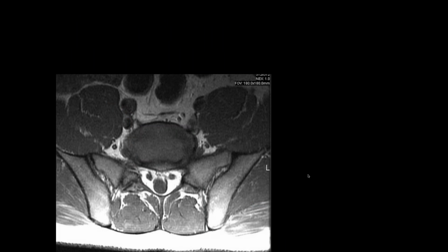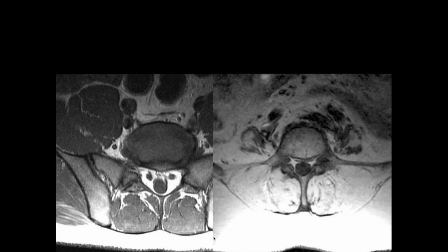Okay, so I'll take this. Here we can see nicely hypertrophied muscles, and then here is severe muscle atrophy. Just pointing all this out, I really think you should comment upon the status of the muscles in most people when you do MRs of the lumbar spine, because I really think this is a much more common cause of back pain than any of the other stuff that the radiologists normally talk about.